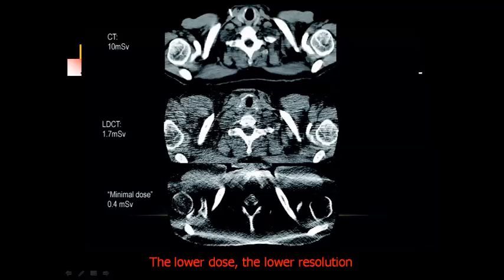If you want to minimize doses from diagnostic CT, you will decrease the exposure dose of X-ray. What will we obtain? Let's look at these three pictures. You see that in a usual CT study, the picture is quite good, and you may identify organs and tissues in detail.